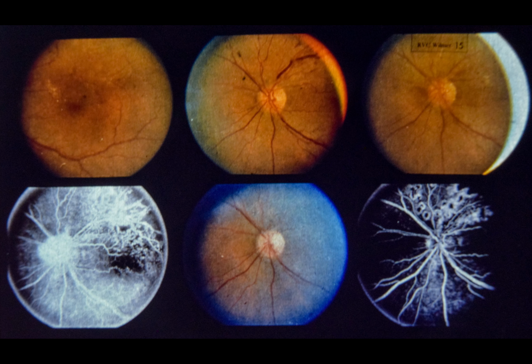Comment: the Diabetic Retinopathy Study demonstrated that scatter photocoagulation treatment reduces the risk of recurrent vitreous hemorrhage in patients with disc neovascularization. In branch retinal vein occlusion, large areas of retinal non-perfusion are often found in the involved quadrant of the retina. This patient demonstrates that scatter photocoagulation in the quadrant in patients with disc neovascularization secondary to branch retinal vein occlusion may have an effect similar to that seen in diabetic patients with disc neovascularization.